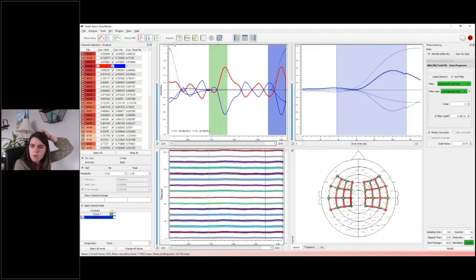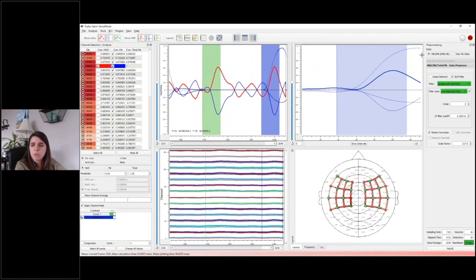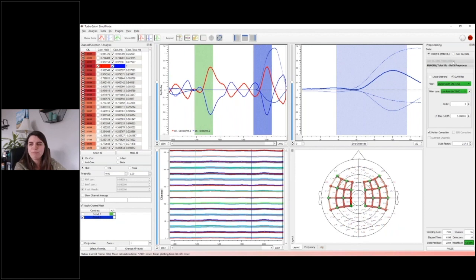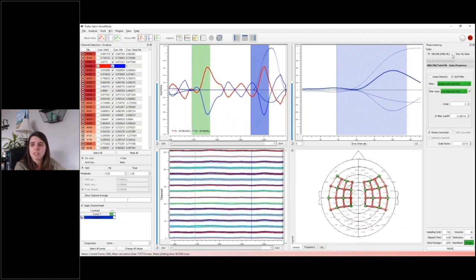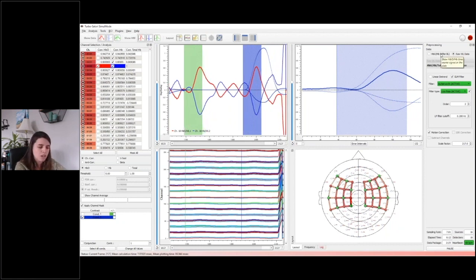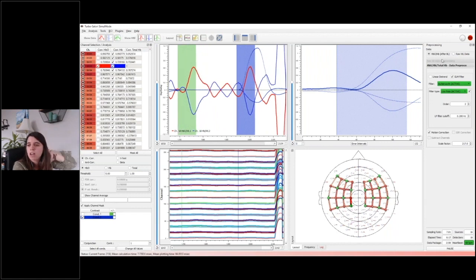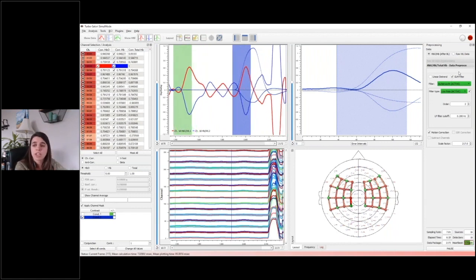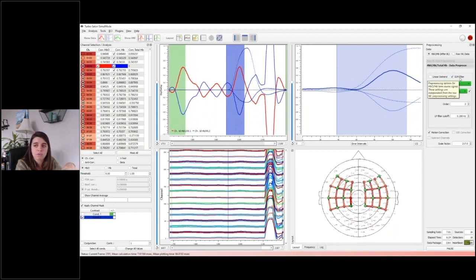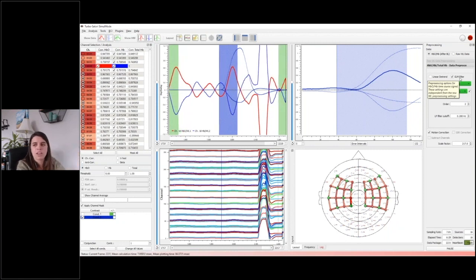So now I'll just quickly review the preprocessing. We have a couple of preprocessing options over here on this right panel. You can preprocess the raw wavelength data or oxy and deoxy data. You can only do one at a time. So we're going to preprocess the oxy data. We're checking off the option for GLM filter. So this will apply our confound predictors, as we discussed earlier in the presentation. And there's a separate panel for declaring those confound predictors, and I'll show you that in a moment.